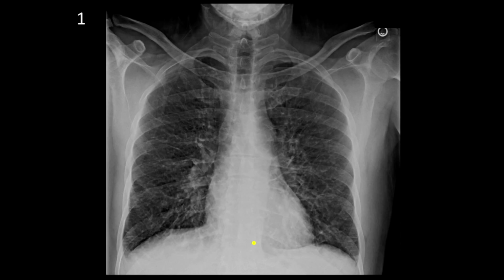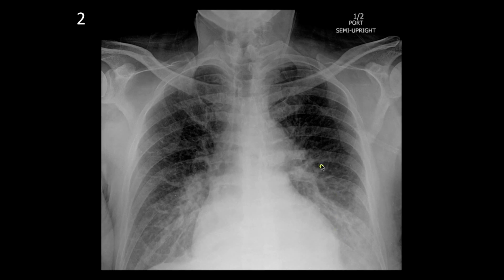We have another patient. This patient, we had 3 subsequent x-rays. In this patient, the heart does appear of a normal size, but again, you can appreciate all these fine reticular markings really throughout the lungs. And when you look carefully at the left base, you can see here again that the patient has septal lines or Kerley B lines. So these short linear structures that extend out to the pleural margin, and this is compatible with interstitial pulmonary edema.